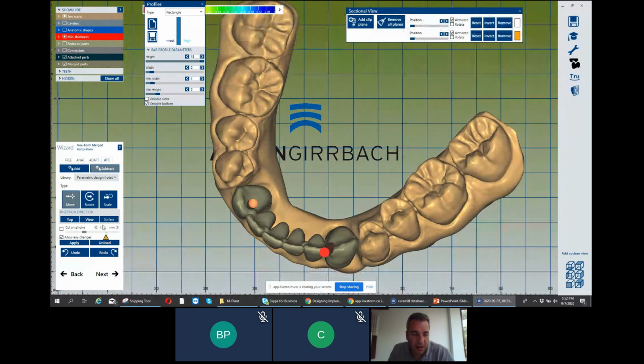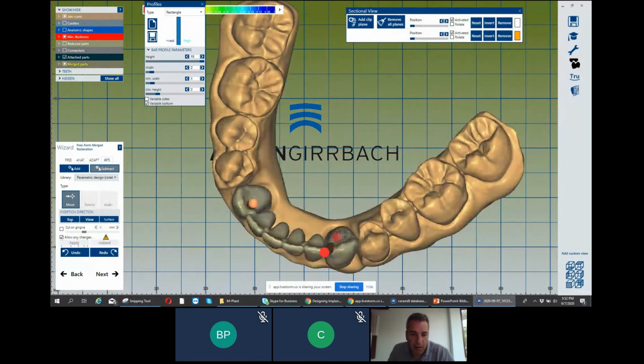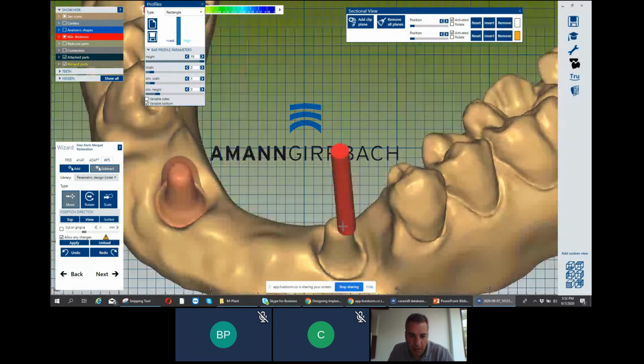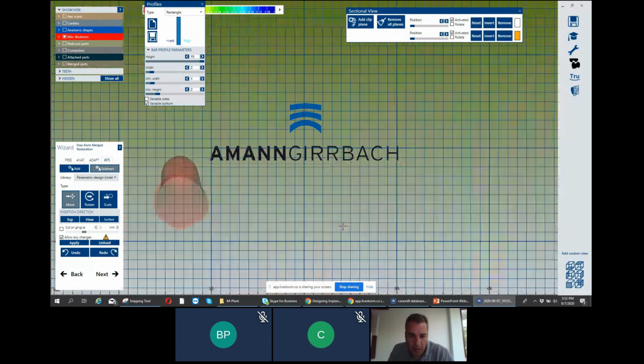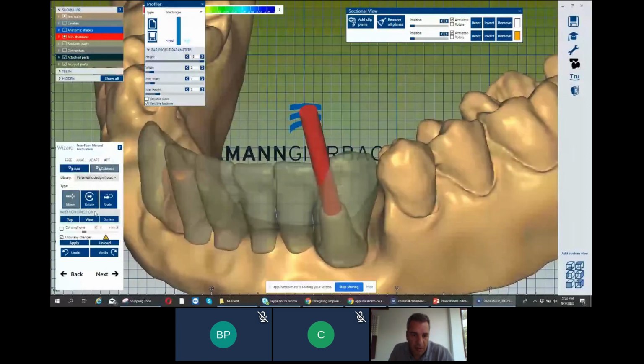Here you just tilt it, undo, place it. It's not working because, rotate, go up, move.